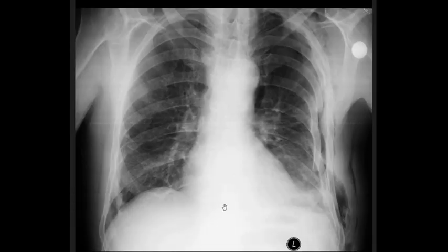So let's now look at this picture. So here we see that this is a correct lung field, nothing special to see here. But as we see here, we see asymmetry. The first thing we can identify here is that the ribs are broken if we compare them to the healthy side. From the second to the sixth or seventh rib, there are broken ribs.